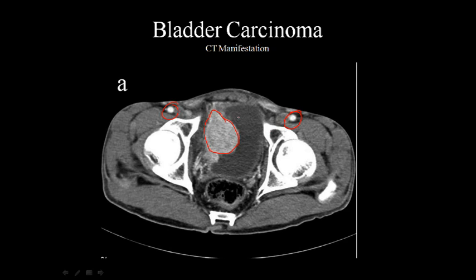And so this whole area here has shifted what looks like the bladder contents this way, and really caused a measurable decrease in bladder volume. And that's what a bladder carcinoma will do. Typically on your contrast enhanced arterial phase, you'll see the mass enhanced due to the fact of high amounts of blood flow to this region.